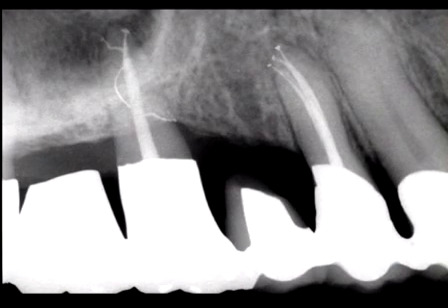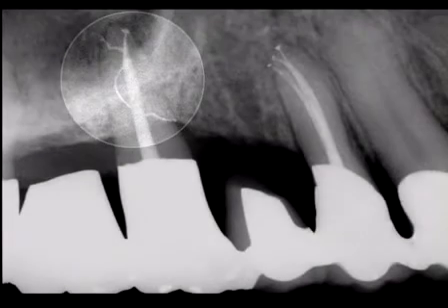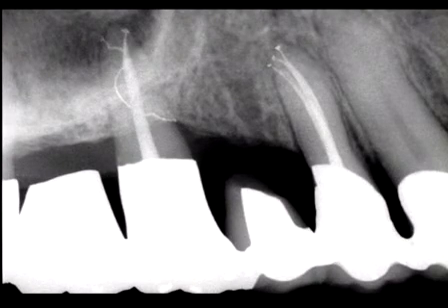Here's another case that exemplifies interdisciplinary treatment. The buccal roots have been resected off the maxillary first molar. You're looking at the palatal root, the lone pier abutment. Notice the apical bifidity, the outer loop, and a mesial lateral canal to the crest of bone. The result is restorative excellence and long-term success.